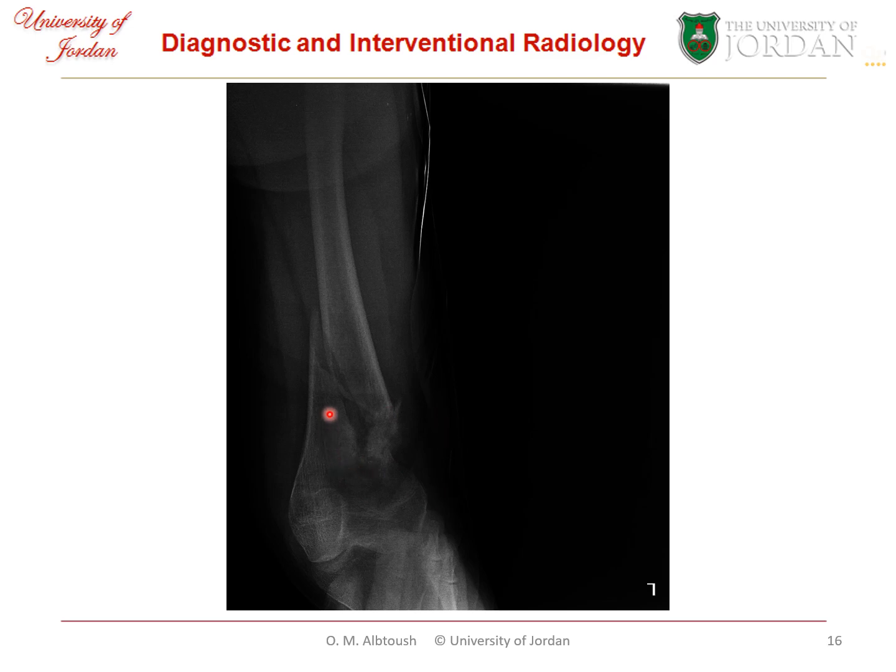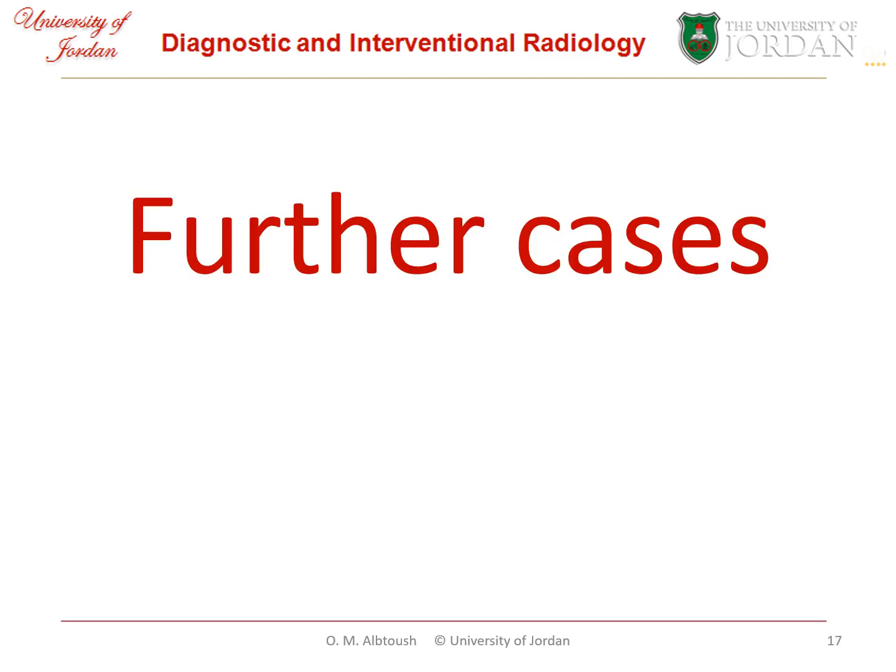So as you can see here, if I want to draw the boundaries, I will try. From this side we have a partially defined border of a soft tissue mass at the site of the fracture. So in fact, this was a pathological fracture.